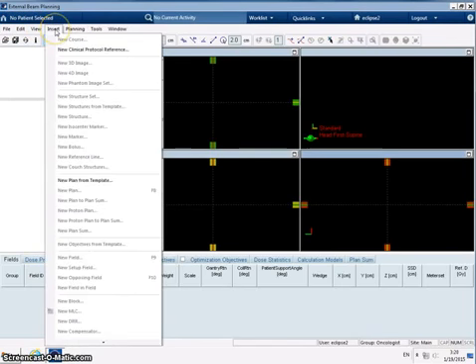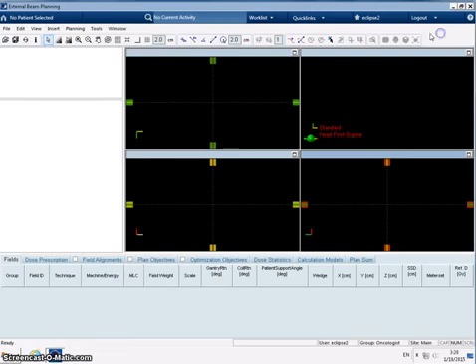We can select things in the menus, for instance a new plan, or there are shortcuts as well, as with lots of other Windows software. So if we wanted to create a new plan, we would hit F8 and that would do the same. There's a number of icons across the top which we'll talk about when we come to use them, but similarly, as you'd see in other Microsoft things, as you hover over them it tells us what they do.